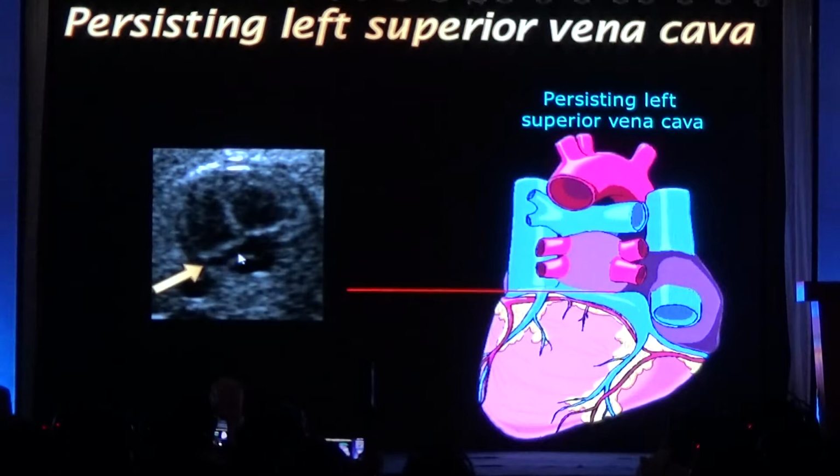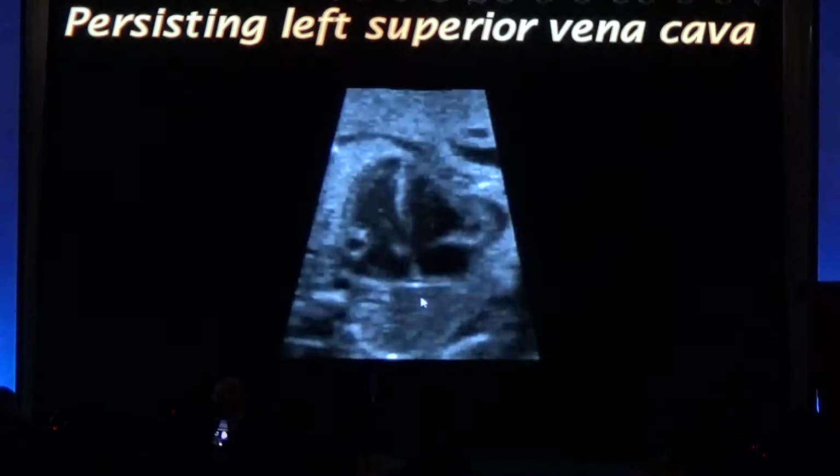And if you see the coronary sinus and it's distended, then you know that the persistent left superior cava is draining in the coronary sinus, and then you think about the heterotaxy syndrome, look them up, and if you don't see heterotaxy syndrome, it's essentially a very benign anomaly.